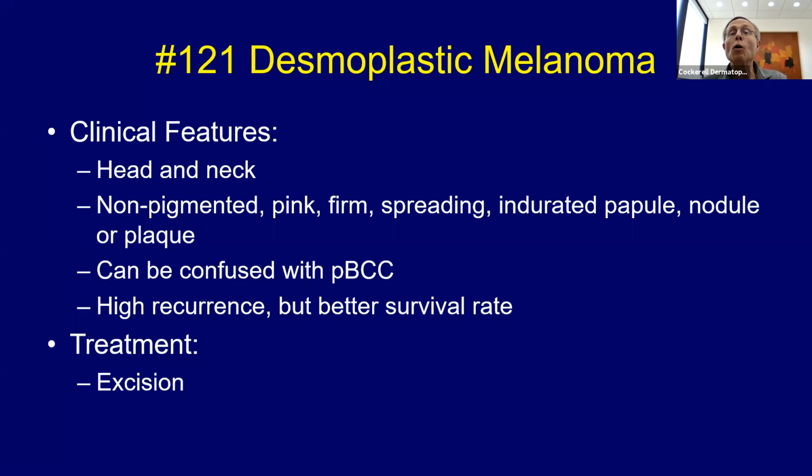Maybe it doesn't show the atypical melanocytic proliferation overlying it, which you can see maybe 30 to 40% of the time where you don't see that. And maybe it just looks like a sort of a bland spindle cell lesion. And maybe it looks more like a neurofibroma, something like that. So you can easily miss this diagnosis clinically and histologically, and then it ends up in a medical legal situation. So you have to be careful of that scenario here.